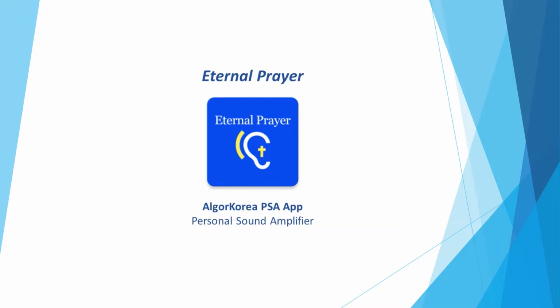Warning: if you use a sound amplifier without a doctor's prescription, your hearing can get worse. Be sure to plug in your earphone or pair your Bluetooth headset with your mobile phone before starting the PSA app. Make sure your Android version is 8.1 or API 27 or higher. The output audio level may be slightly different based on the mobile phone's volume settings, microphone, and earphone or headset types.